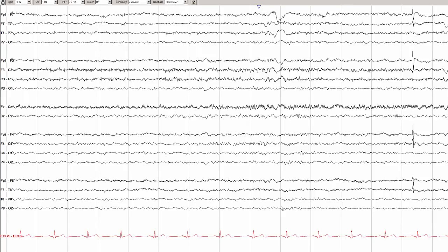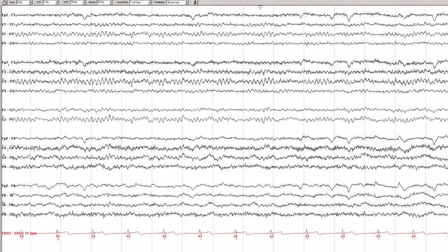As you look for focal slowing, it will take a long time to review a routine EEG recording. However, with experience, you will become more proficient at recognition of patterns, and it will be easier to screen for this focal slowing. Here is a slightly different example of focal slowing or focal cerebral dysfunction, but again, the same approach works. Starting with the first 1 or 2 seconds, compare analogous head regions on one side and then the other.